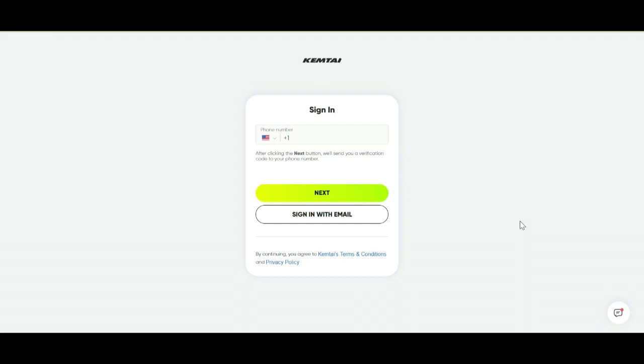The patients you create manually will be able to access the specific login URL for your clinic using a link they will get to their email addresses and to their phones, or they will be able to log in after they signed up using the QR code that you will hand to them after creating it with a QR code generator. So right now, let's try the login with the email option. This obviously works also with text messaging.